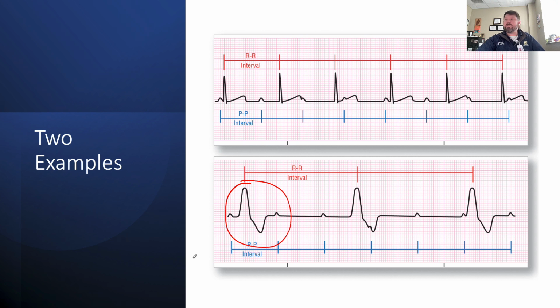The P-to-P intervals across the board are the same, if you notice, as demonstrated here with the little graph, but the supraventricular, so the P waves, and the ventricular waves will have no association. Even if you happen to see what you think is a PRI, it's just because it happened that way. It's not a PRI that is part of the strip.